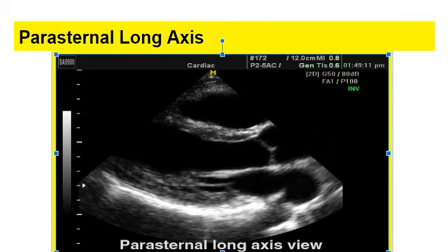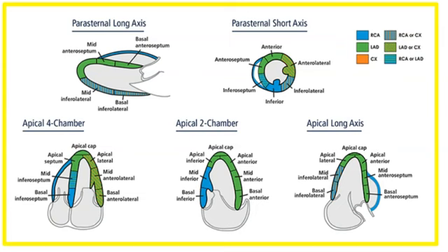And the coronary artery territories for the parasternal long axis view are, as I depict right here. And you can see right here we have different segments of the heart. This here is the anterior septum. There's also a posterior septum of the heart. This is the anterior part of the septum in the parasternal long axis view.